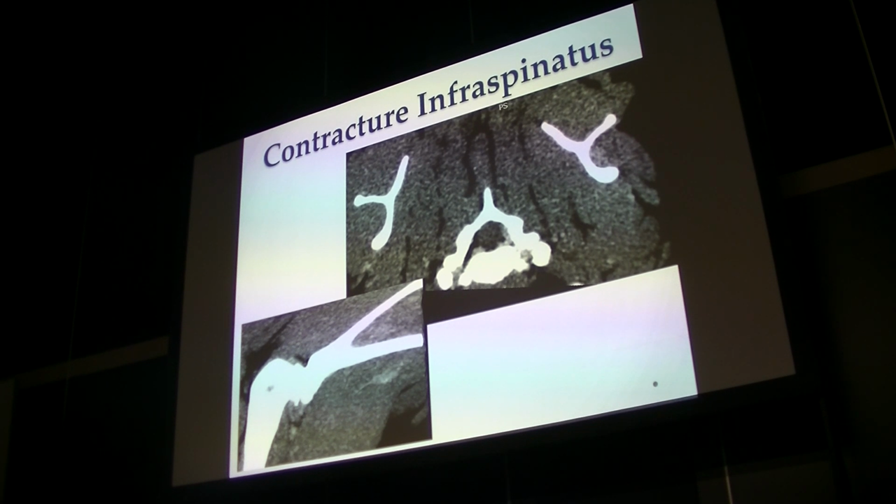We recently had a case in the clinic where we could pick up the lesion of the infraspinatus, and this is a transverse image at the level of T1, so the dog is in thoracic position, and we have the area of pathology, the normal area. This is the scapula, of course.